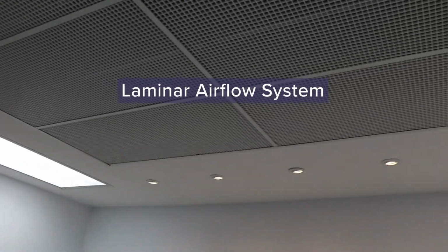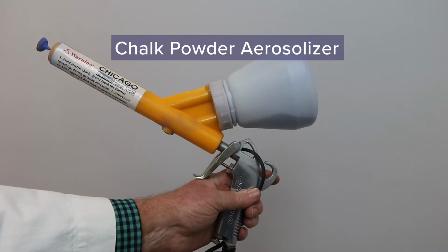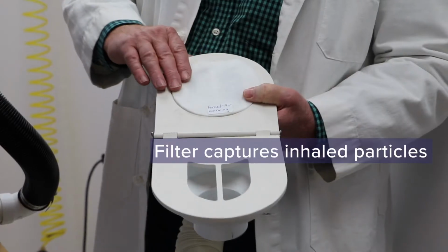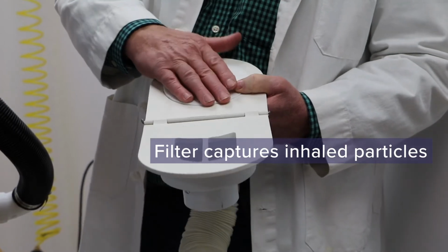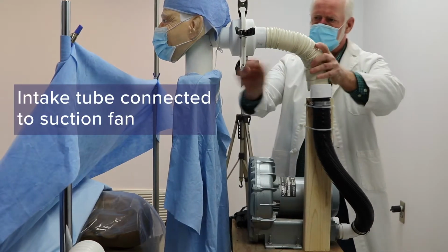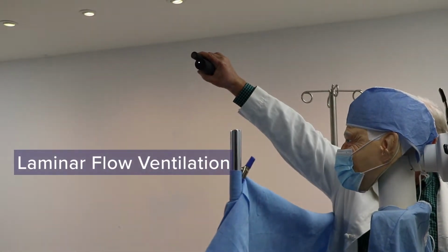The laboratory is equipped with a laminar airflow system. An air-pressurized gun dispenses blue chalk powder to simulate airborne contaminants. A clean filter is placed over the airflow path to capture inhaled particles. The intake tube connects the anesthesia provider to the suction fan. The laminar flow system is effective.